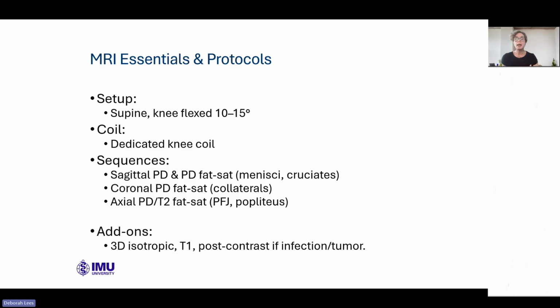And failing that, we're looking at the T2 weighted, and we're looking at the STIR, because a lot of the stuff we're looking for is edema, we're looking for swelling, we're looking for fluid. So a lot of the pathology around the knee is fluid based. So that is why we tend to go towards the fluid weighted type images.